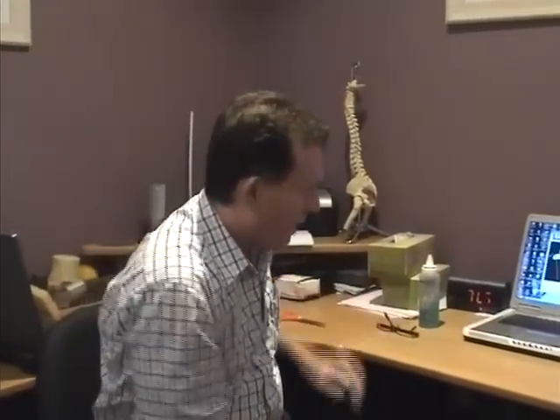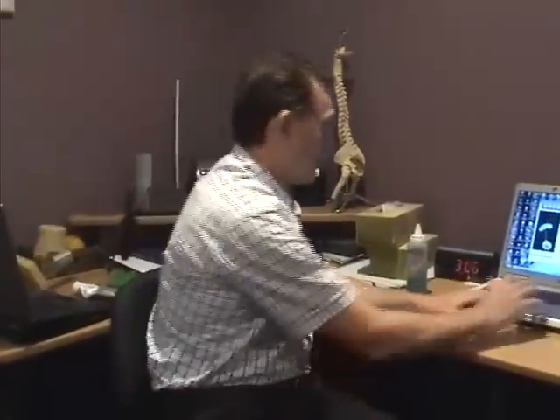Have you asked the question yet? Have we got the question on video? What we're actually looking at? What he wants to look at is forefoot varus, but one of the other questions was also how to interpret the graphs.